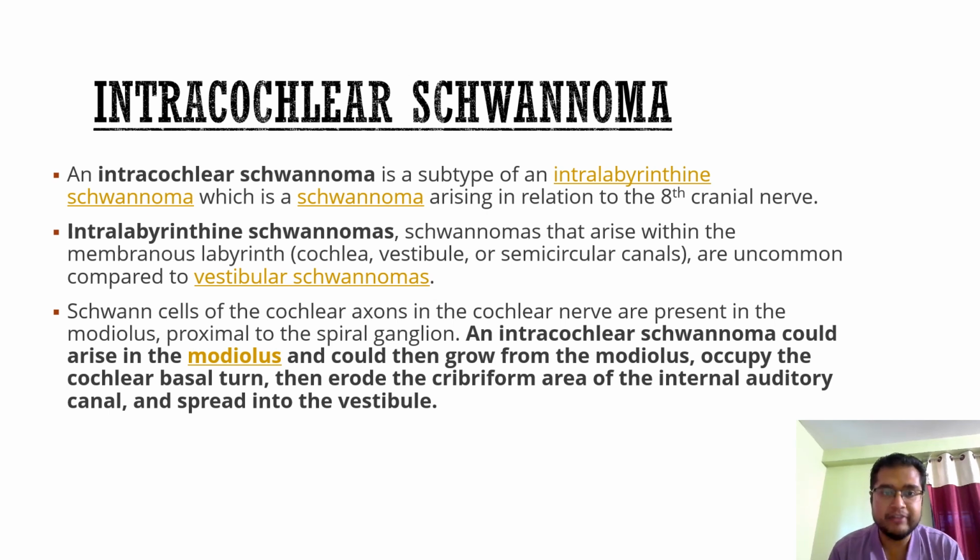So to diagnose intralabyrinthine schwannomas or intracochlear schwannomas, typically thin T1 post-contrast sections are required. So a patient who's presenting with progressive sensorineural hearing loss and there is no diagnosis on CISS images, and there is suspected schwannoma, definitely we should get T1 thin post-contrast sections to look for intralabyrinthine schwannomas.